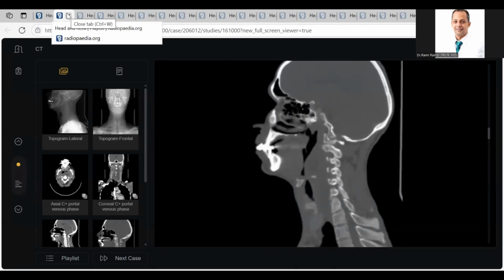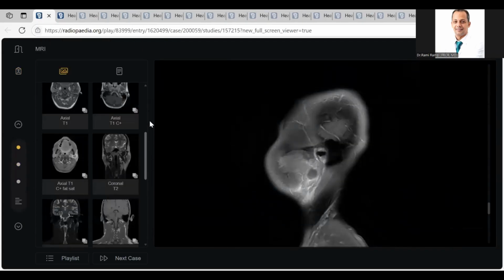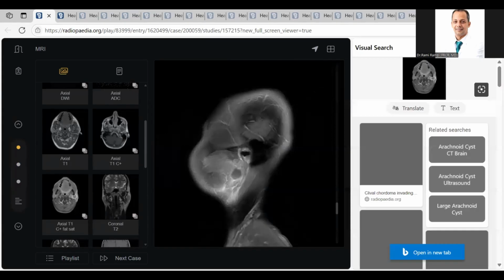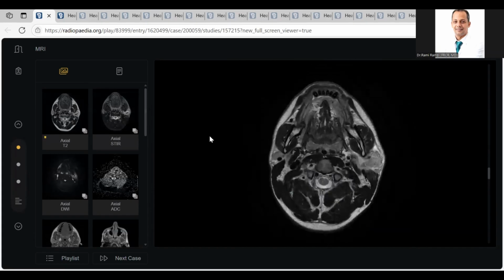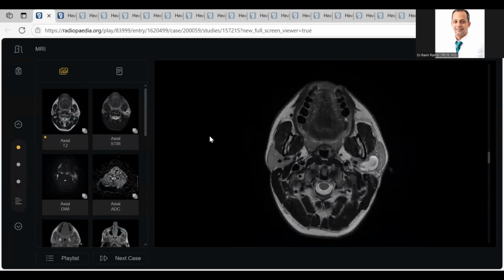TB cases are very, very common during examination, either in long cases, in Viva, even in short cases. Expect it, my colleagues, very common. This case is an easy case. But why do I insert this case? Because it is easy and maybe missed by most of us. There is an abnormality here in the parotid.